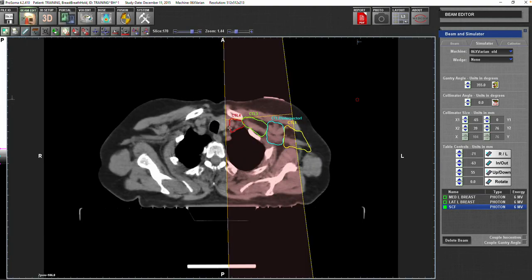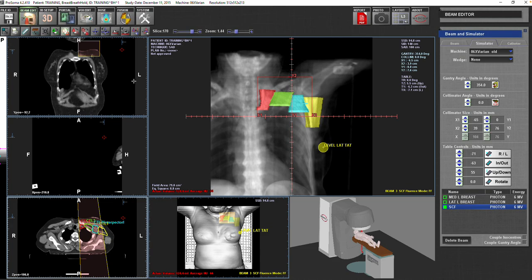So now you are covering CTL1 properly while you're not touching the spinal cord. And this is the idea of what angulation away from the spinal cord means. If this is 0, then there will be 5. So this is the gantry angulation that I forgot to say.